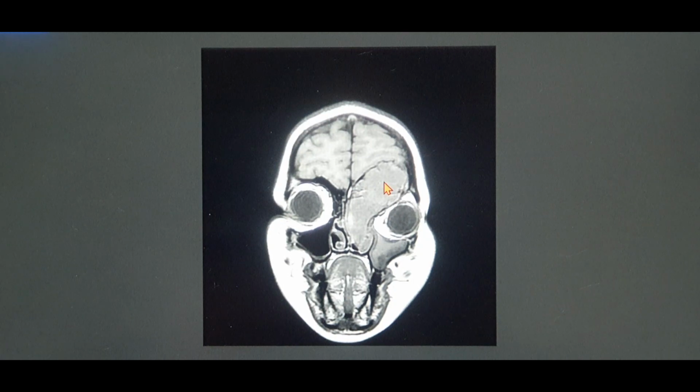So there you cannot see any place of hyper intensity, so there is no protein here. Sorry, not protein exactly, but there's no mucin, so there's no chance of AFRS in this patient. This is a case of clear fluid on T1 without any hyper intensity.